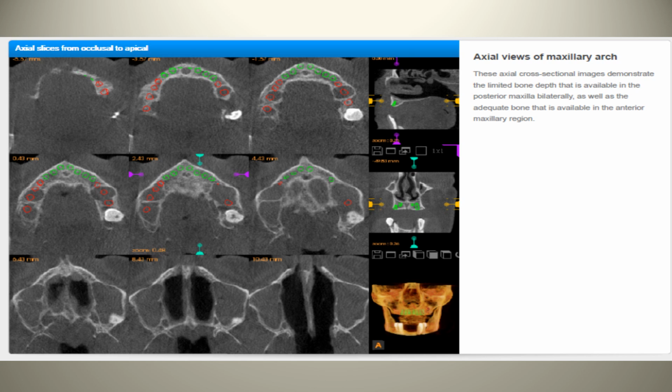And in areas where things are red, basically what it implies is that there's anatomical limitations with respect to what can be done, either as a result of a lack of bone or a lack of bone volume, or the requirements for other procedures. So in the maxilla, that would typically involve either some sort of bone grafting, onlay appositional bone grafting, or sinus lift or something like that.